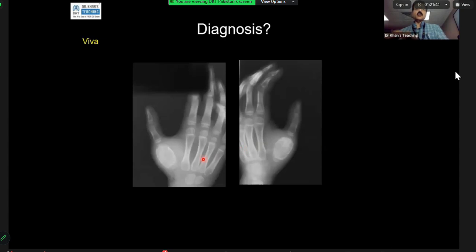an aunt minnie case. What is an aunt minnie case? An aunt minnie case is where there is no differential diagnosis. In the 2B exam, the trend of aunt minnies is less and less because the examiners know that candidates have mastered aunt minnies. So an aunt minnie by definition is a case in which there is no differential diagnosis. But this is an aunt minnie case. What is the diagnosis? Can you describe and give me the diagnosis? Still, you should know what it is.